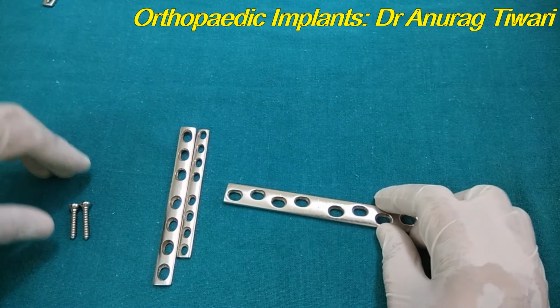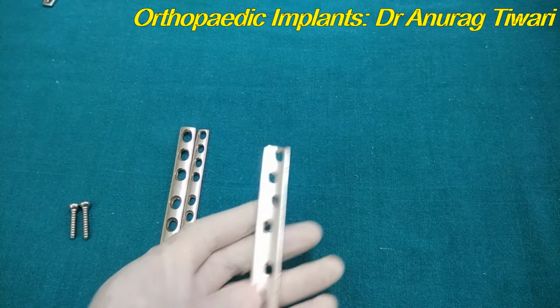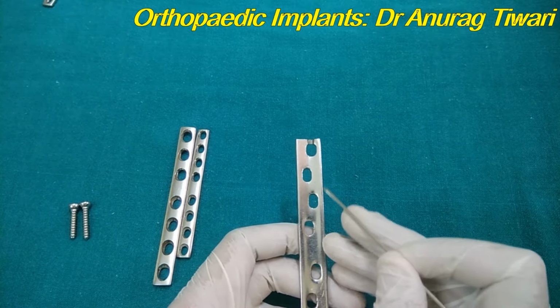So for this, they have devised a low contact or limited contact DCP. The limited contact DCP, I do not have on this table, but it is just the same as the DCP. However, they have made grooves over here.